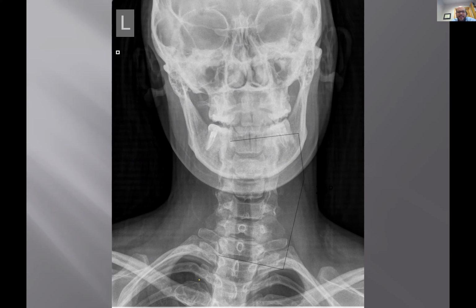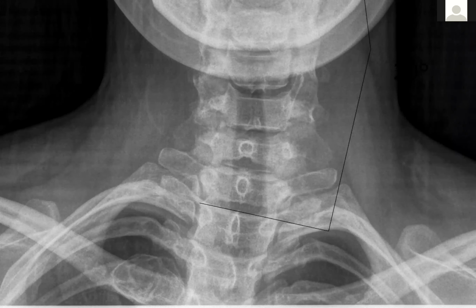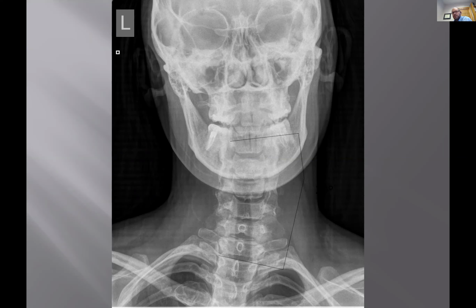Look at that. I mean, it's kind of mean, right? It's just right at the edge of collimation. Yep. But look at that. There is a kind of blown out osseous lesion here, right on the edge of collimation. Now that I circle it, you can't get your eyes off of it. Am I right? And that's the nature of this stuff.